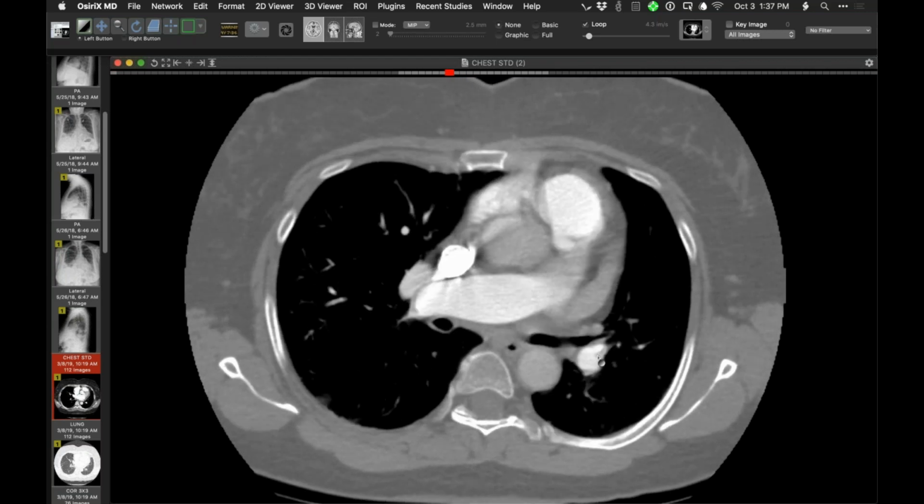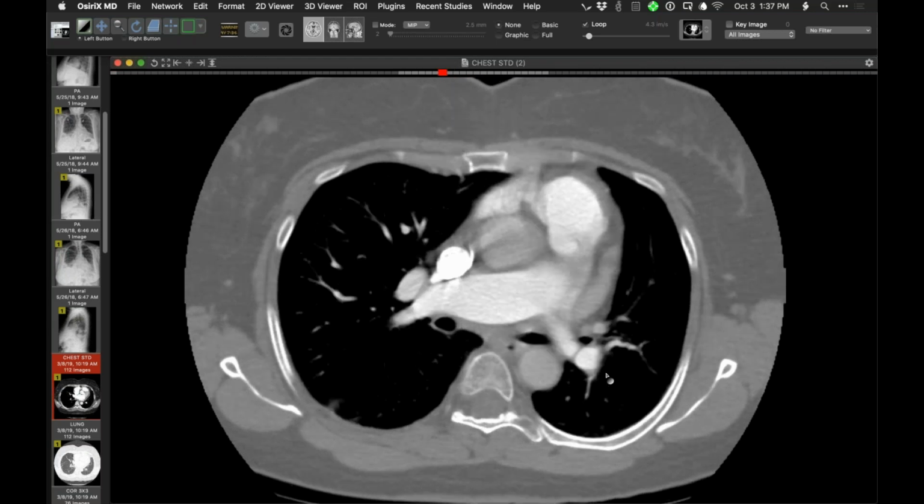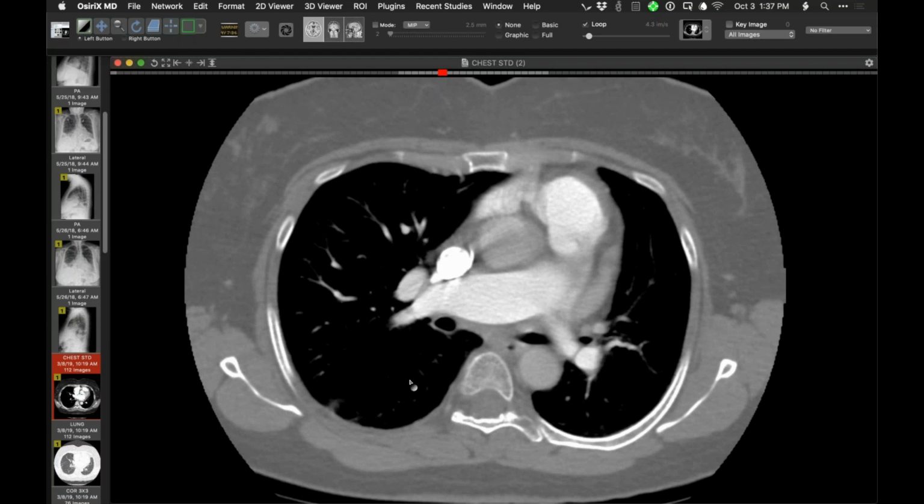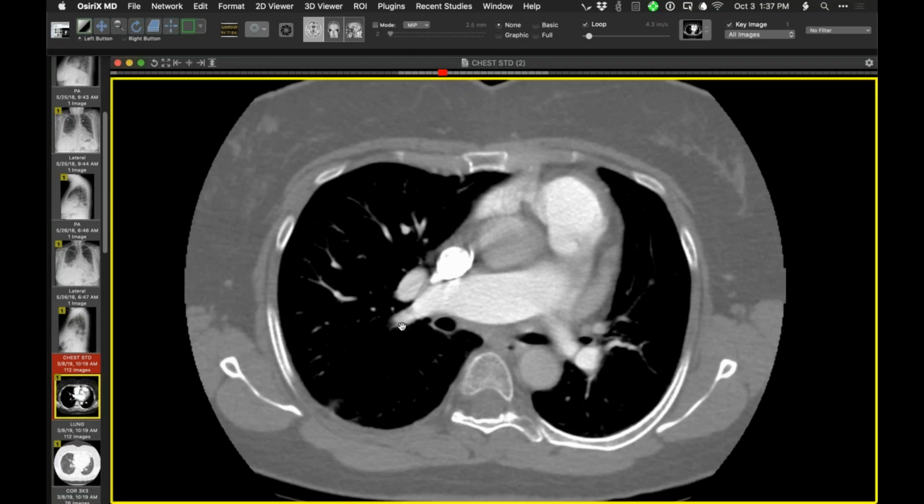Here is perhaps a luminal abnormality that goes along with CTEPH, perhaps there as well. So this patient has severe pulmonary hypertension. We do have one surgeon here that does pulmonary endarterectomy, and that was performed. So let me show you now the before and after. Sorry, that's not what I wanted to do.